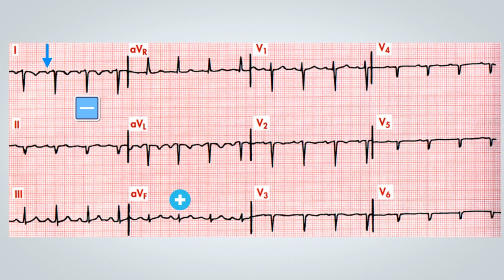When we move to the precordial leads, the R wave progression that I mentioned earlier, which usually starts with a small R wave in V1 and grows until V6, is not happening here. On the contrary, it's a moderately sized R wave that is decreasing as we move towards V6, just as the amplitude of the QRS complexes is also reducing.